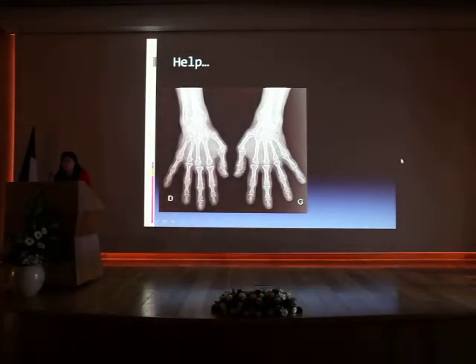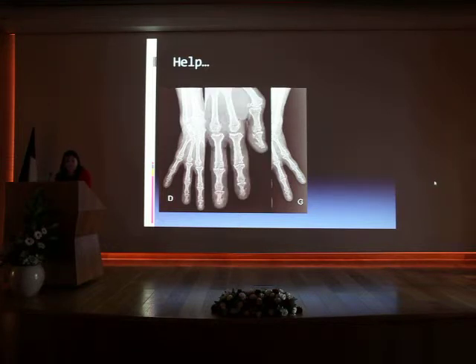Here's a little help about the final diagnosis. We had x-rays of both hands here. Can you see something? Here, when you magnify the picture, it's heterotopic bone formation, periosteal reaction. There are wing-like osteophytes. It's a seronegative spondyloarthropathy, probably psoriasis. Maybe erosive osteoarthritis. Let's focus on the tuft here.